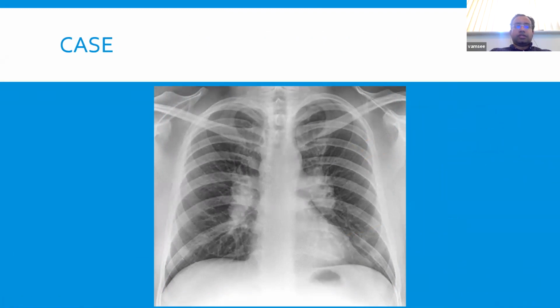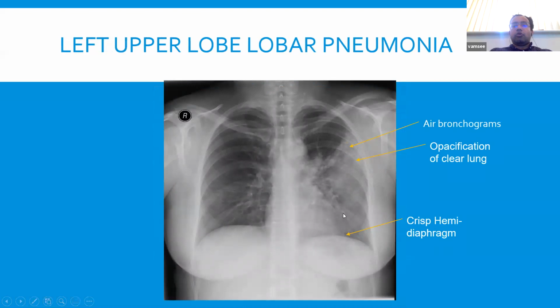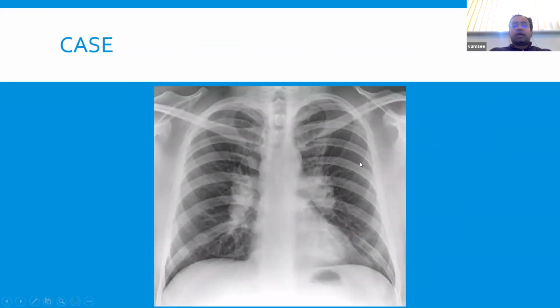Yep. Well, that's perfectly right. Consolidation, left middle zone. Yeah. So I would probably say that it extends to the lower zone as well. But yeah, most commonly in the left mid to upper zone. Yes, indeed, that is correct.